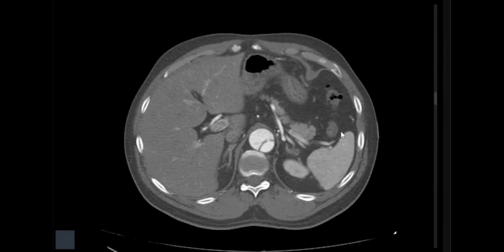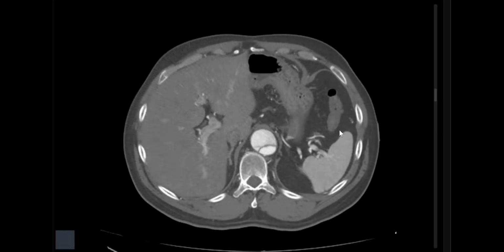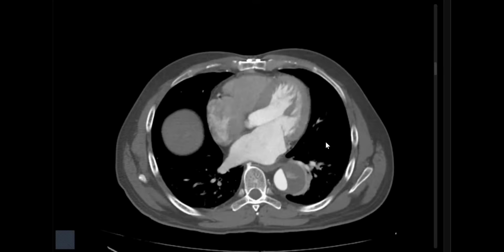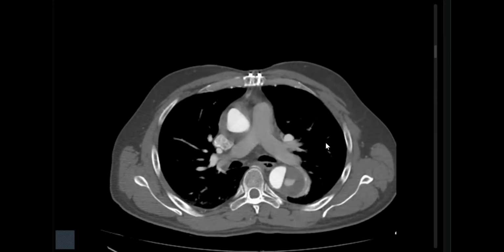You're talking about general signs. I'm talking about local signs here in this image, for example, or this cut. Yes, the opacification. The true lumen will be more opacified, and if there is an expanding false lumen, then the true lumen will be small, as in this case. Good. So opacification and size. Okay, anything else? I will also look at the upper extent of the flap.